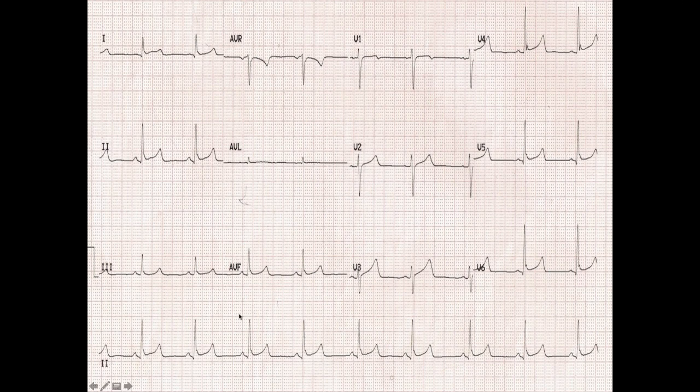So we've got that all over the place, and on this EKG, we do have some of that notching. Especially V4, you see that little notch right at the end of the QRS complex. It doesn't always happen. You don't always see it in benign early repolarization, but those two things put together, the hallmark sign being that concave upward slope into the T wave, on top of that notch at the end of the QRS complex, it's going to tell us that this is benign early repolarization, and I shouldn't be calling a code STEMI into the hospital.